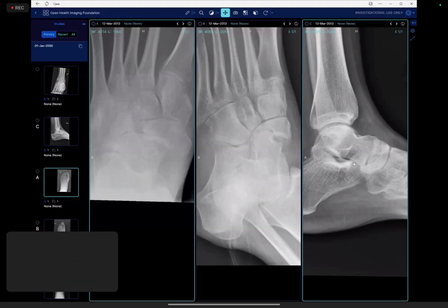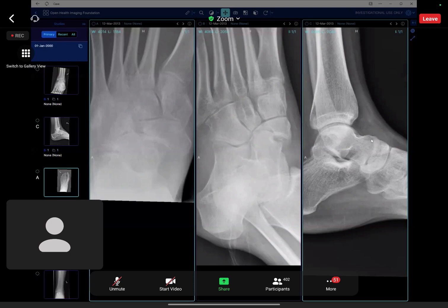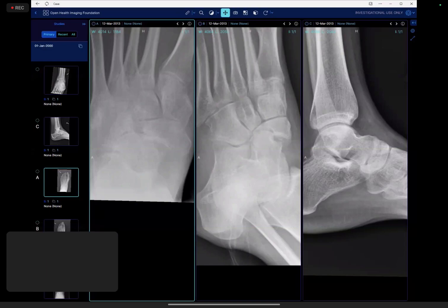Talus is here, but if navicular is here, what do you think is happening? Could there have been previous injury there?